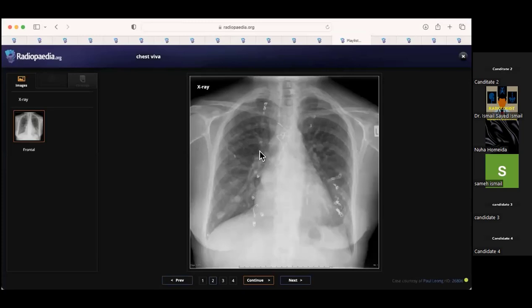She's a 62-year-old female with acute shortness of breath. I have been presented with a frontal chest radiograph for an adult patient with history of acute chest pain. My main finding is multiple post-embolization changes seen at both lung fields.